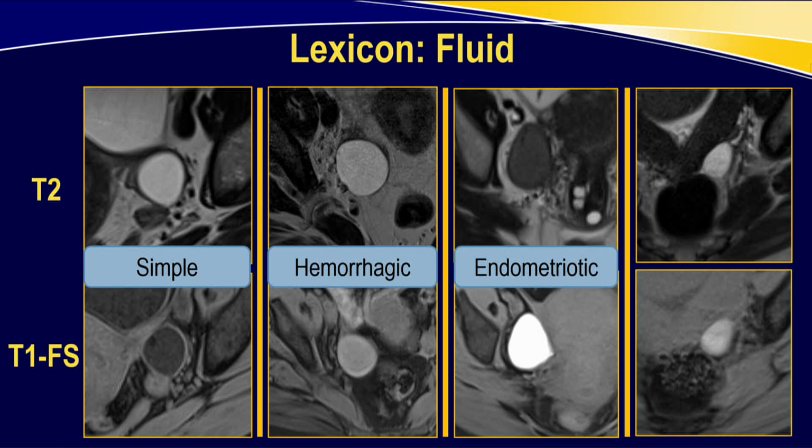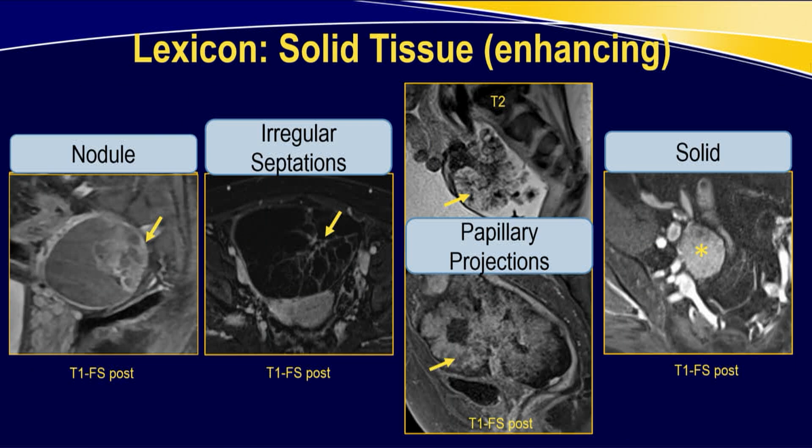It can be endometriotic, and the most typical appearance of an endometrioma on MRI, or the most specific, is high signal intensity on T1 fat suppressed technique, falling in signal, or called shading, with a loss and dropout in signal on T2 weighting. And then there's proteinaceous, which very much parallels the hemorrhagic findings, which is not surprising, they're both protein, high on both T1 and T2 weighted sequences. But it gets more complicated, or it gets more specific.